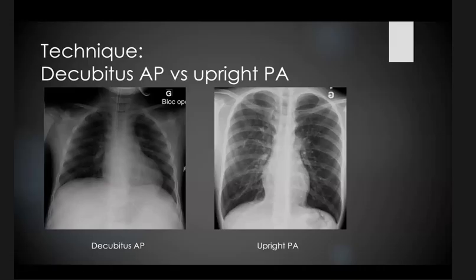So your lung magnification will be a bit more, and the heart will be a bit bigger. In small children, you can have up to 0.6 of a cardiothoracic ratio, instead of 0.5 for older children and adults. It's not a good thing, but as a rule of thumb, you can expect a bit bigger heart on that kind of view, especially in neonates.